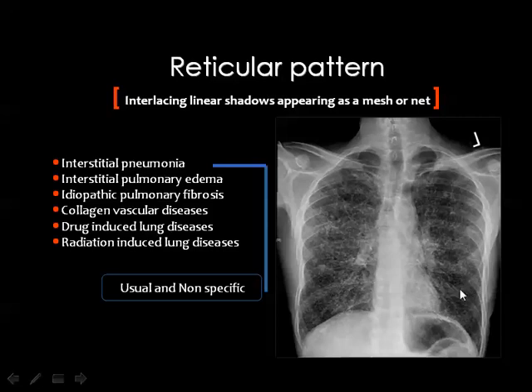And anyone also, I feel that these are patches. Can you feel this? Yes, okay, and this is absolutely right. How to verify the underlying pathology? We should have the high resolution CT. Then, whenever there is a conflict in the plain X-ray, we should go to the high resolution CT to be sure.